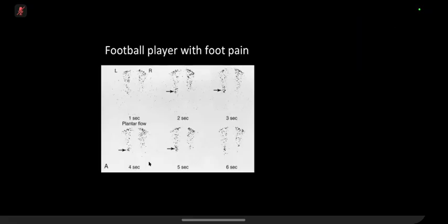Yeah. So I think this represents potentially a triple phase scan. So the first set is going to be looking at whether there's hyperemia in the area, of which at 5 seconds there's already an arrow very kindly put in the area where there is increased foci of intensity, which would indicate hyperemia.